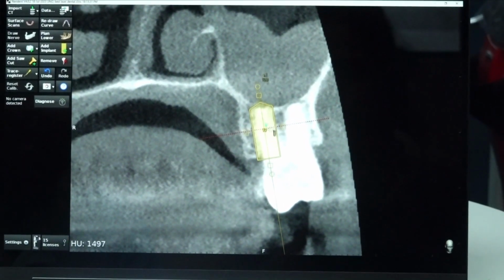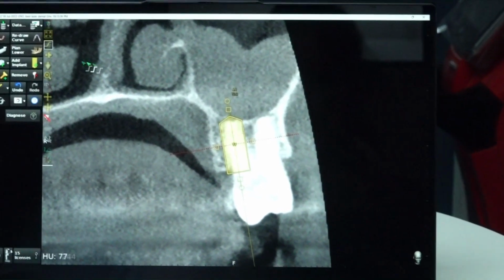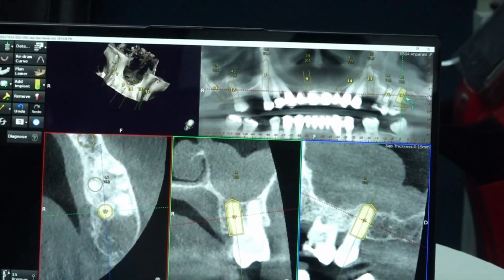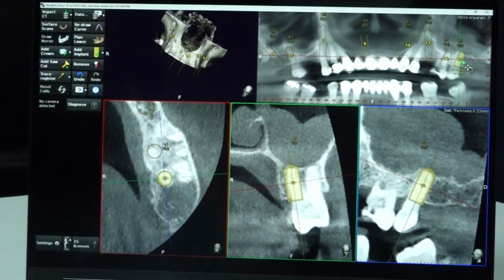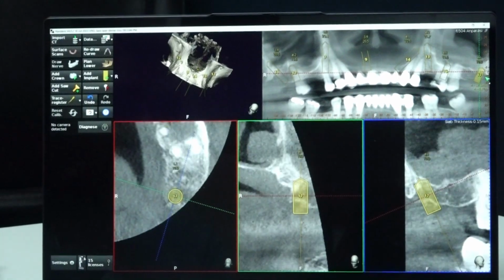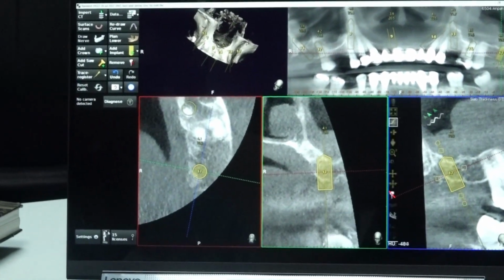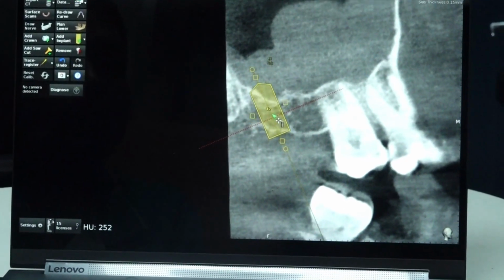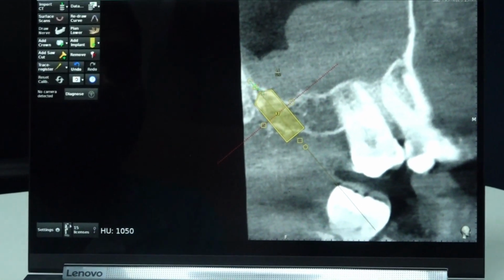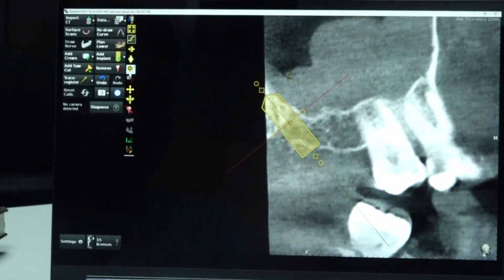5.5 by 10. Okay. And we will just see how the pterygoid is present. Pterygoid has not come in this X-ray fully, right? So this is a pterygoid and tilt. Pterygoid is not very favorable because the sinus has expanded even in the pterygoid area.